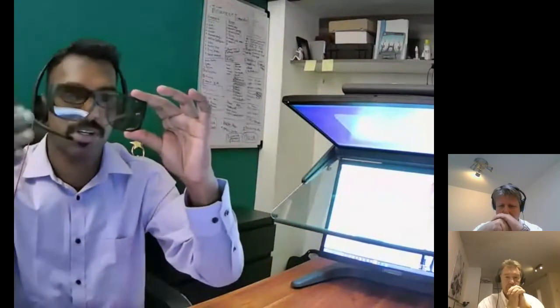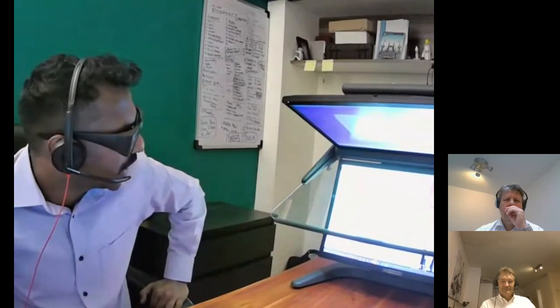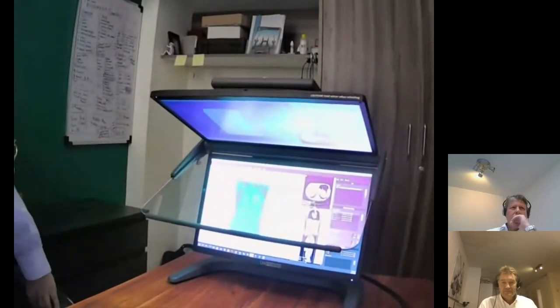And as Joseph was telling yesterday, you can actually see people even if you are wearing this. And these are polarized glasses, much safer for longer use. You keep it on the glasses, and still I can see you, the presentation. I can see Stefan, Joseph, Mark, Argen. So this is the monitor, and I'm seeing this beautiful data set in true stereoscopic. I'm sure that it is overlit. Let me just move in here, and I'll switch off my lights.